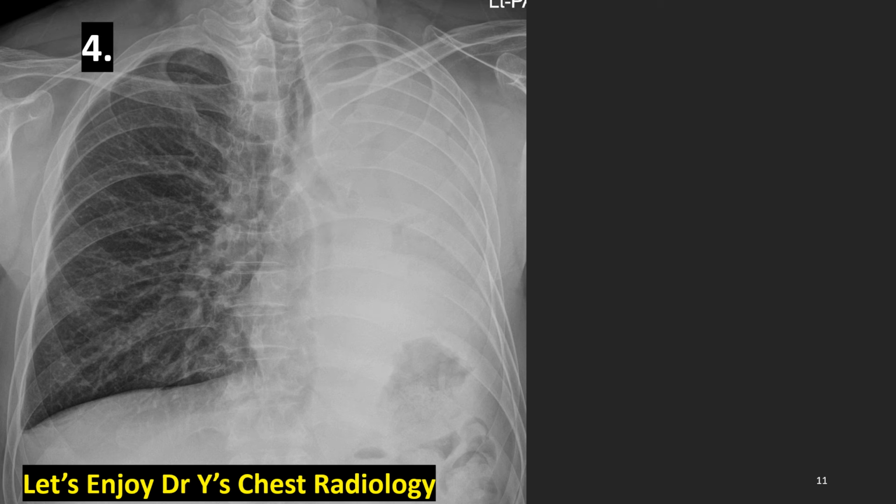These are all telling us left lung collapse. And finally, let's trace the left large airway. Where do we find the blind pouch of the large airway? Distal left main bronchus. That is the tumor focus.